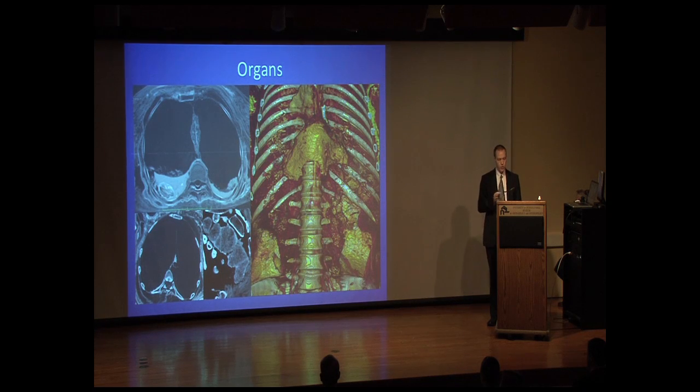And the intestine, stomach, and urinary bladder are reduced to fine, easily disrupted structures, again appearing as linear opacities, although if we're lucky enough to get some fecal matter in there, we may see characteristic bowel loops. Come on, who doesn't want to see characteristic bowel loops?